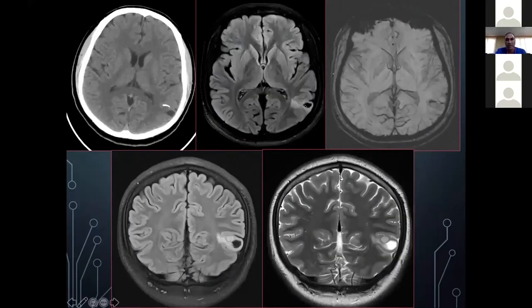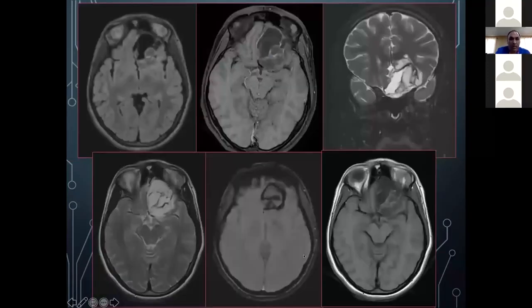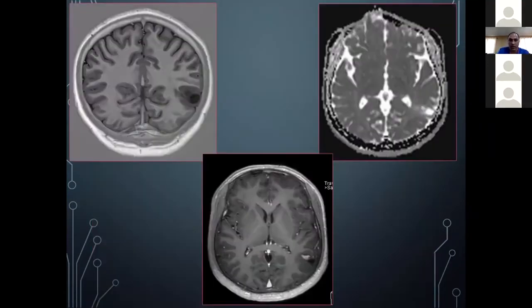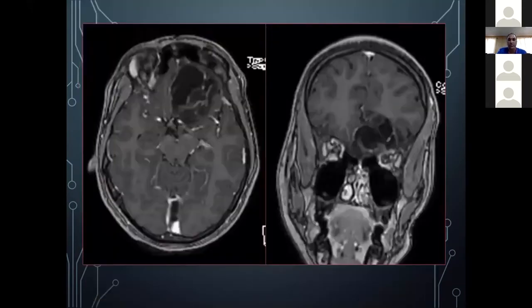Calcification is there, cystic area is there, underlying white matter signal change is there, susceptibility shows the calcification, and they can sometimes show enhancement and can be actually pretty large and atypical in appearance. For example, this here, it is showing enhancement. There is no diffusion restriction. Always look for the temporal lobe MTS even when you have identified a pathology. This is an atypical appearance, large lesion with a lot of hemorrhage present, and bizarre looking appearance. But it is also a case of ganglioglioma.